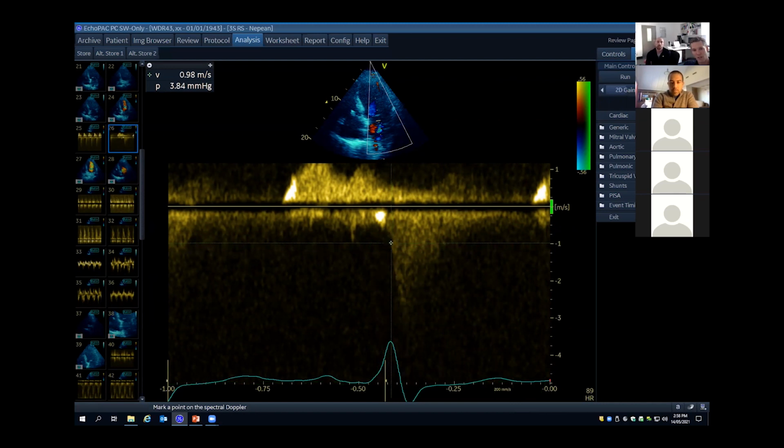I put the cursor on the mitral regurg at the 1 mark, go from there, and it's the change in pressure to 3. That means you have a 32 millimeter of mercury pressure difference over time, and that dP/dt gives you this value of millimeters of mercury change per second.